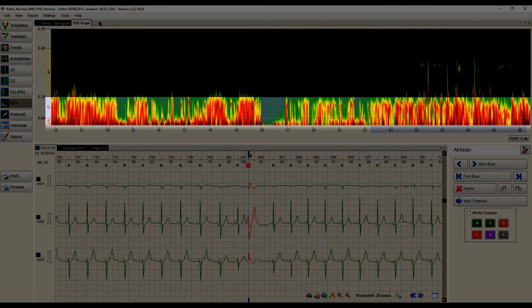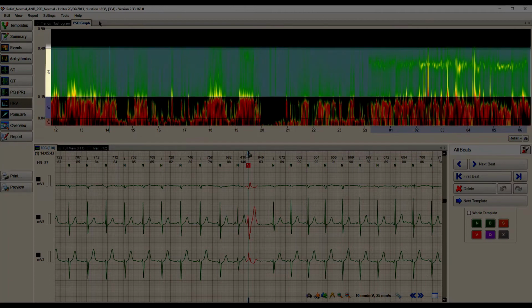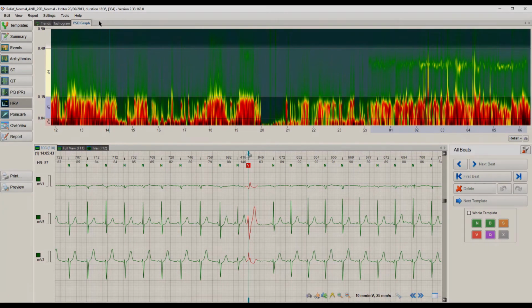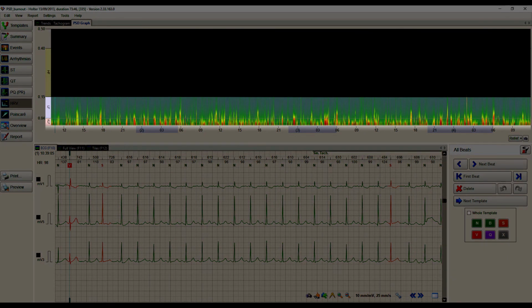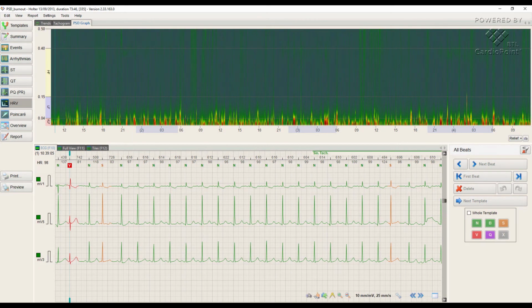Sympathetic activity is mainly observed in the low-frequency range, and it normally should be seen during the day, while in the high-frequency range we can see the dominance of the parasympathetic division that occurs at night. The next example is a clear picture of the burnout syndrome, almost complete failure of regulatory processes. Most often, we see such a picture in a person after prolonged physical or mental stress. The night period is indistinguishable from the daytime. Regenerative processes are not observed.